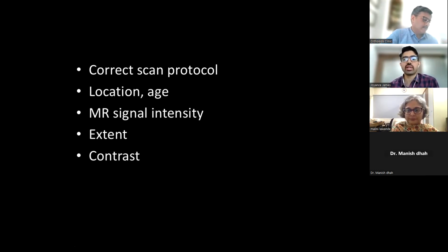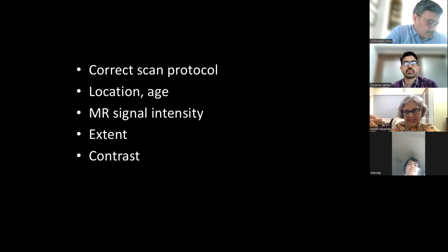First is, what are the MRI signs of malignant transformation of osteochondroma? So for osteochondroma, one is the thickness of the cartilage, which normally is less than 1.6 centimeter, but these are not absolute figures. Especially in children, in the growing skeleton, you may see a bit of heterogeneity within the osteochondroma itself. But also look at the thickness, is it smooth or not? Is there any bone destruction and extraosseous soft tissue component?